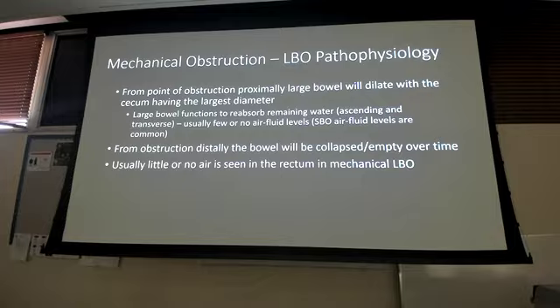The thing with large bowel is that it reabsorbs the remaining water, so usually we don't have any air fluid levels. That's another way you can tell the difference between large bowel and small bowel. If it's upright, do I have air fluid levels? That's what I want to know. If I do, it's probably small bowel, plus the valvulae conniventes with the lines coming across.